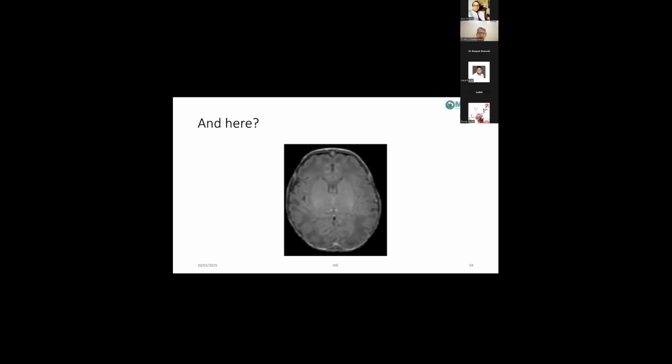Cool. What is going wrong here? Again, I'll give you the things. T1, black CSF, head, of course. Looks like a fuzzy brain again, with poor gyri and sulci delineation. We can see some white spots underneath. Somewhere closer there is a hyperintensity. Yes, there's a hyper signal intensity there.